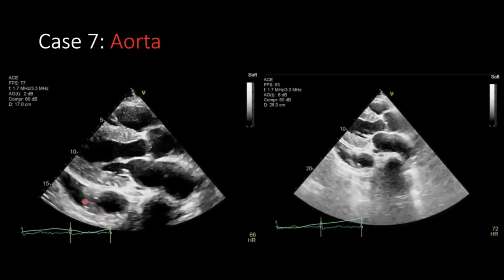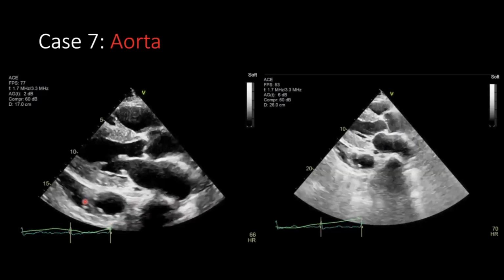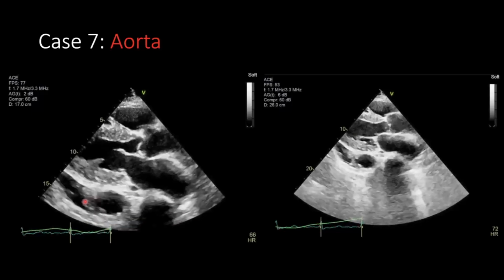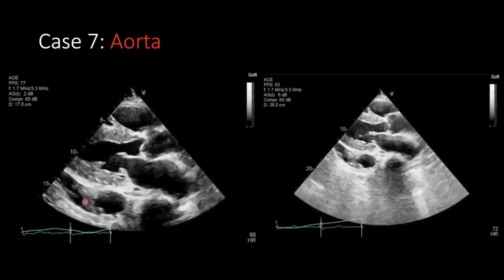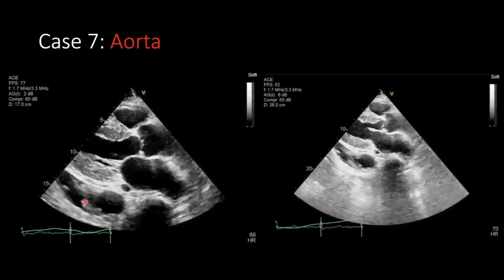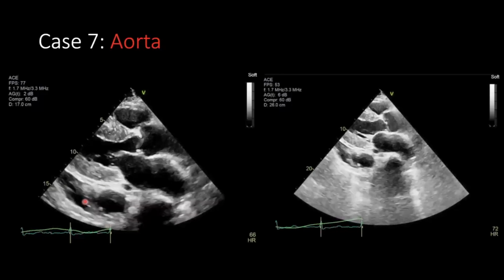We can actually see the spine fairly often in these, especially in really thin patients. As Ashwin mentioned, it's really the shadowing. And you will see patients with scoliosis and other spinal abnormalities. I don't think this position for the descending thoracic aorta is that unusual. It's just that there's a pleural effusion that kind of throws you off a little bit.